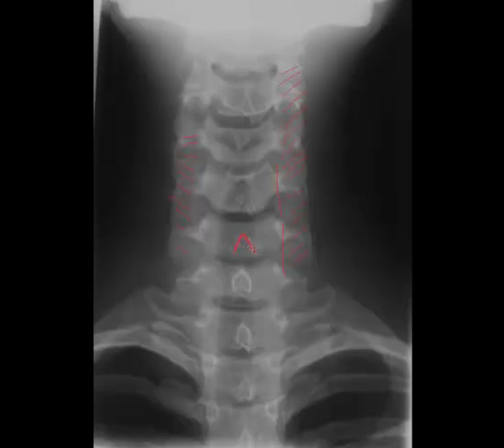Oh, got a little ahead of myself there. I said lastly, but we actually need to identify the TPs. Now, remember that the transverse processes do extend off of the body, and they're typically pretty small on the cervical spine. We're catching the margin of a few of them. These are not typically very well seen.